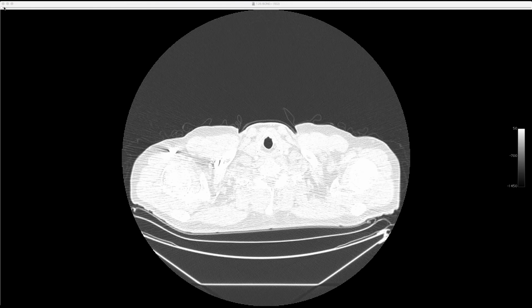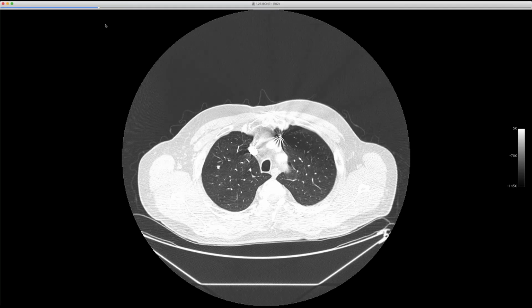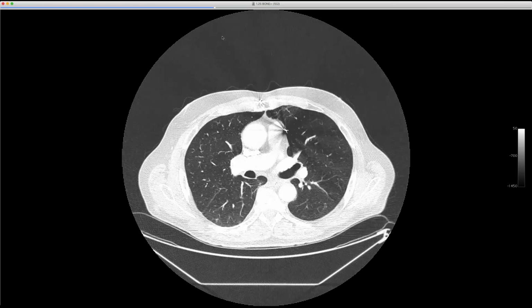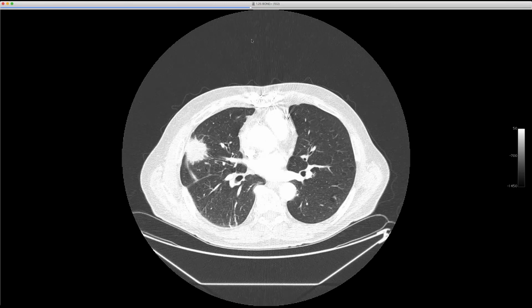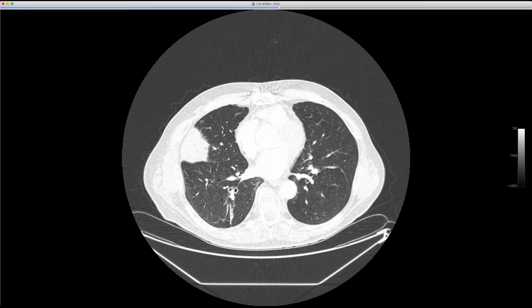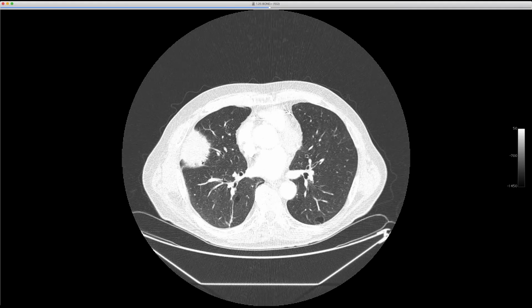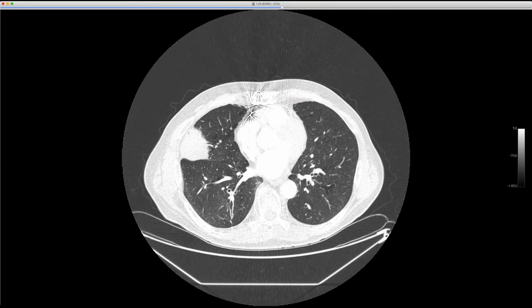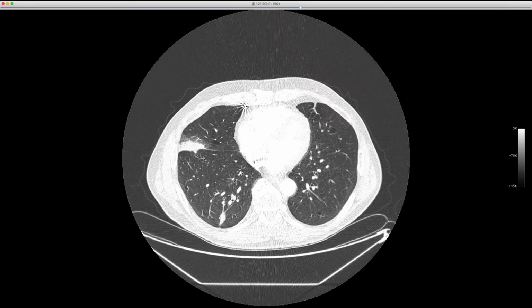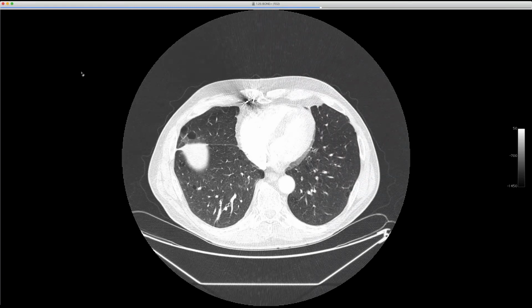This is another patient. This patient has Sjogren's syndrome. So you can imagine where I'm going with this. Has some nodules, has had some heart surgery, given some RFI, but then has some cysts that are basal predominant, perivascular. So some LIP, and then had this big mass. Now, granted, this is 2011. So you might wonder about, you know, they do get lymphomas with Sjogren's syndrome, but potentially, with some immune suppression, could also develop infection.